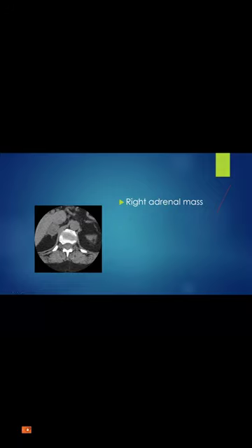Here, right adrenal mass. Again, it's not uncommon to see this, especially as I deal with residents. I sign their preliminary reports, so I know where the misses are, usually what they don't look at. One of them is adrenal masses, intrathoracic or pulmonary masses, lung lesions, because they were just focused on the spine.